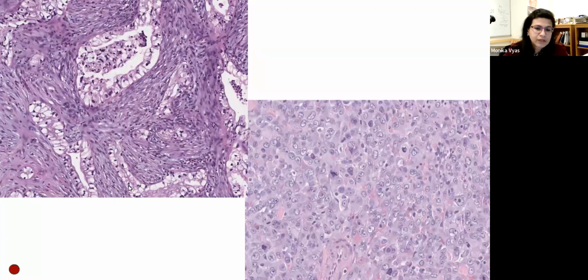One of my attendings used to say the nuclei are pickled because they always have this dense, shriveled look to them. And oftentimes you can also appreciate eosinophilic condensation at the luminal border of the glands. That is due to a villous brush border. So those are all typical features of the foamy gland variant of pancreatic ductal adenocarcinoma.